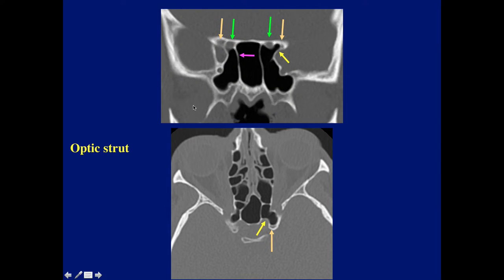One of the things which we should be alerting the clinician to is when one of the septa of the sphenoid sinus ends in the optic canal, because if they're going to do surgery, they have to be careful not to damage the optic nerve if they follow the septum towards the optic canal. So again, optic canal medially, laterally is the anterior clinoid.